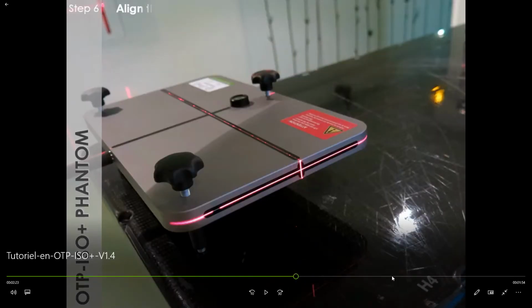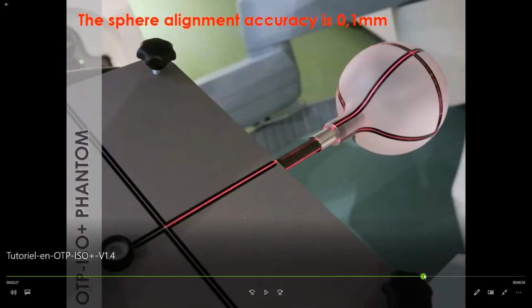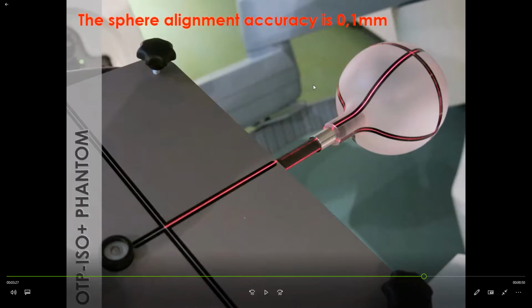And in these MV images, we detect the ring of the isosphere holder to determine couch rotation angles, the peripheral balls of the ISO to determine the gantry rotation angles, and the rotation of the cross-test objects to determine the collimator rotation angle. Once we've done a good job here, we see that the sphere is perfectly aligned, and I repeat, the central ball corresponds to the intersection of the laser planes. We are now able to begin the Winston Lutz test, which will consist in acquiring MV images of the ISO and cross phantoms at various gantry rotation angles.